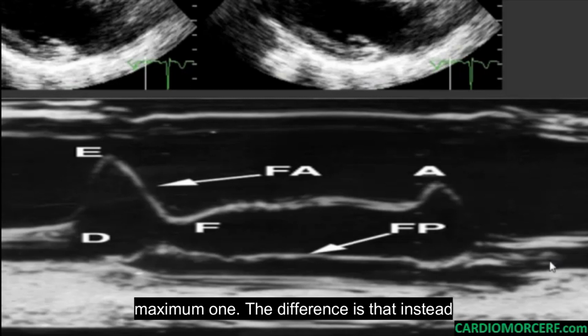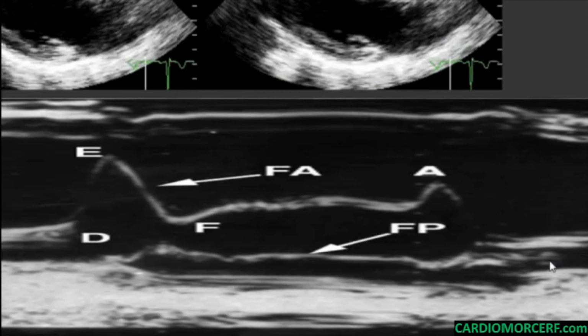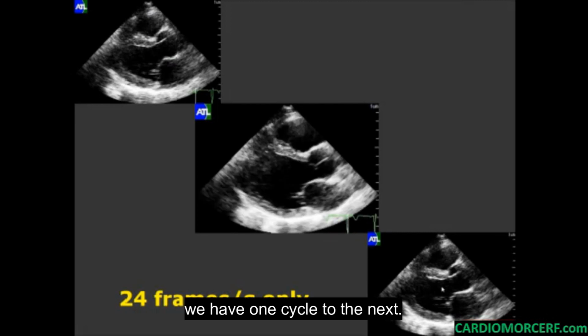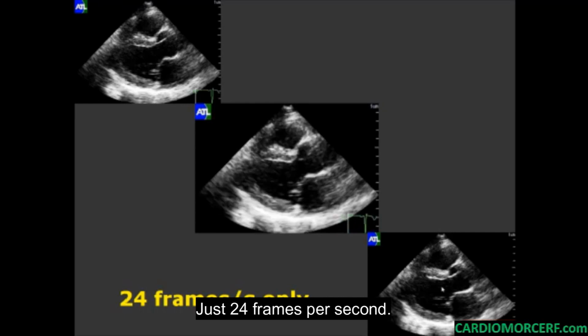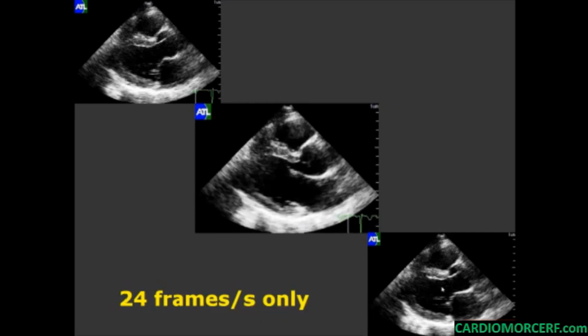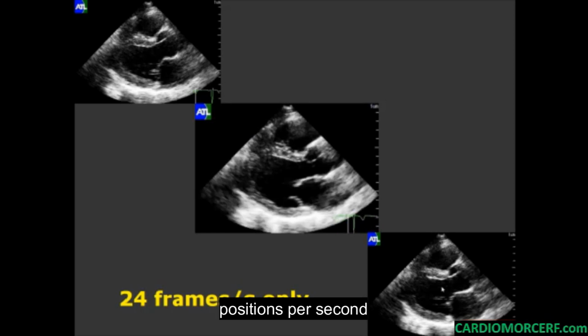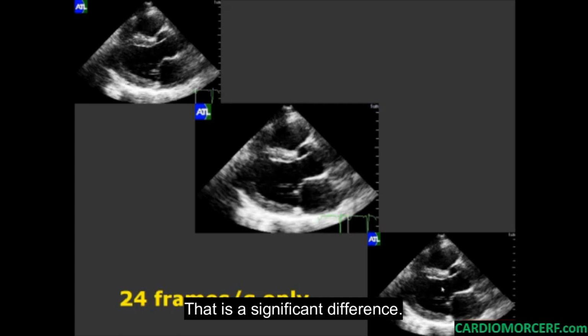The difference is that instead of just 40 or fewer positions per second, with M mode we see about 2000 positions per second. Here we have one cycle to the next, just 24 frames per second with 2D, while with M mode we would see 2000 positions per second. That is a significant difference.